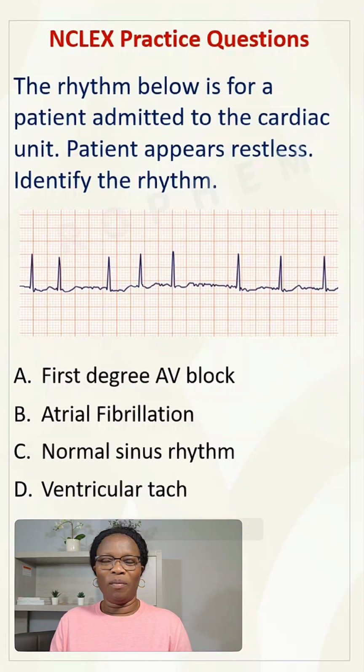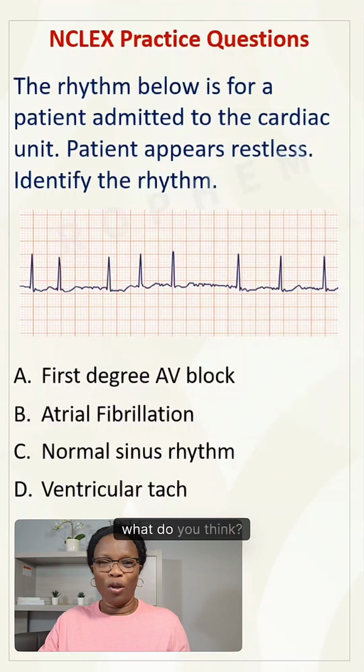Take a look at this one. The rhythm below is for a patient admitted to the cardiac unit. Patient appears restless. Identify the rhythm. So, what do you think?